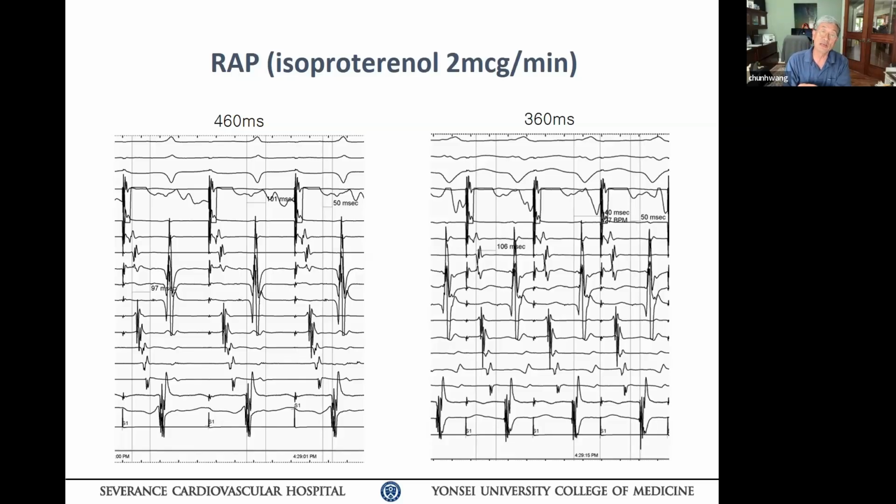And lead two, I assume that's what you're showing second. Do you see the QRS complex of the top surface ECG? This one, at 460, is upright. At 360, now it's biphasic. The delta wave actually changed. You know what it is? How are we arguing this?